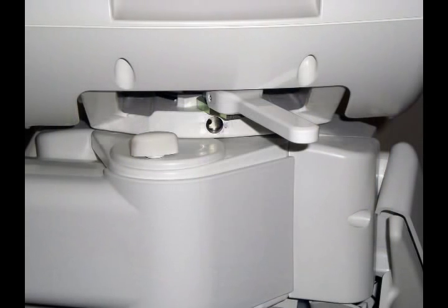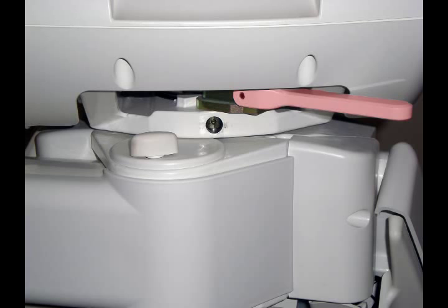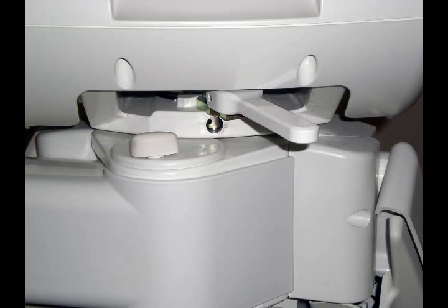On the back of the chair, well below the headrest, where the base and the back meet, you'll see a lever. This lever controls whether the chair swivels to the right or to the left. It's known as a brake. The lever here, or brake, is shown in a tightened position. To loosen the chair so it can swivel, you move the lever to the right. Once the chair has been moved into the desired position, you move the lever back to the left to lock the chair in place.